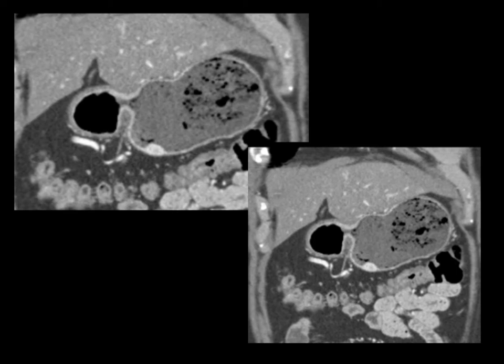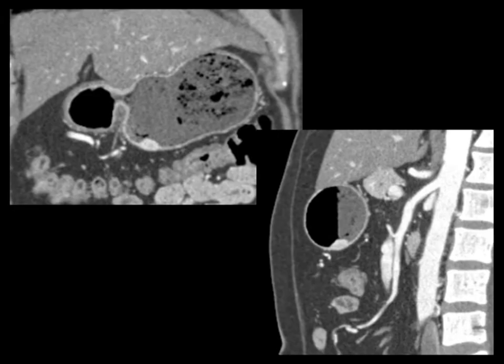We tend to think about carcinoid tumors involving small bowel. We talk about the appendix. We talk about desmoplastic reaction and mesenteric masses. Here you see a smooth lesion on the greater curvature of the stomach, very nicely shown. Good example of a carcinoid tumor. You can see how subtle these lesions are. You can see why water is a great contrast agent when you're looking for small lesions.